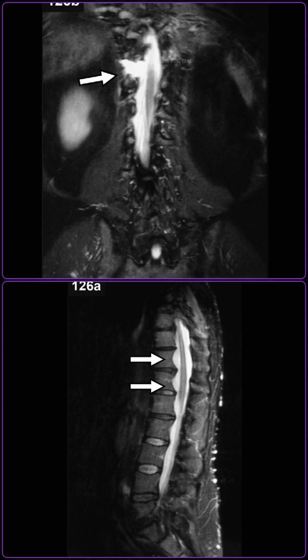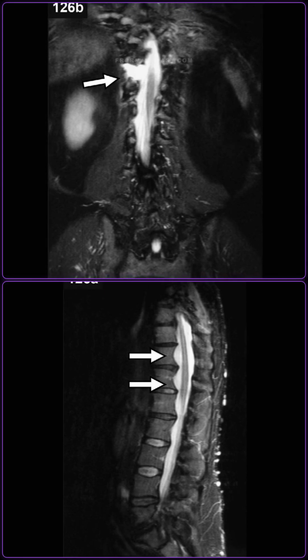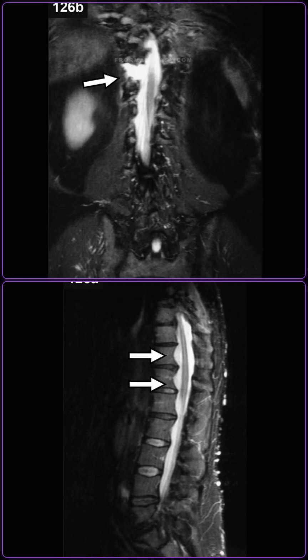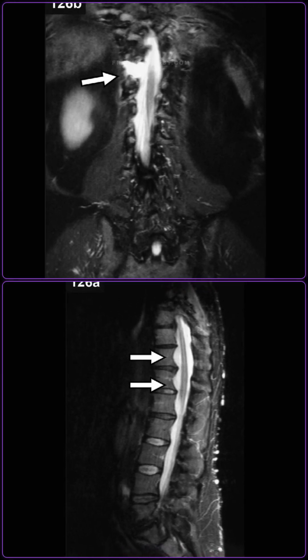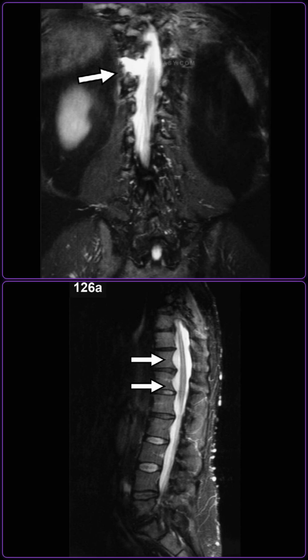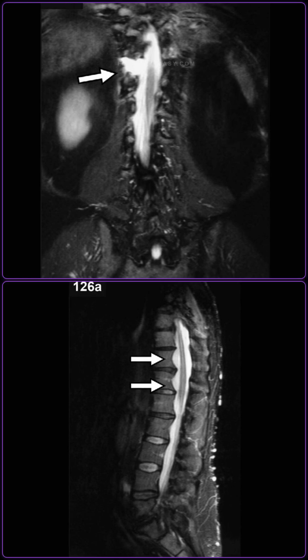On T2-weighted MRI, neurofibromas often display a characteristic target sign, consisting of a hyperintense periphery and a hypointense central fibrous core. Furthermore, a meningocele is directly continuous with the subarachnoid space, which can be demonstrated on thin sagittal or coronal slices. What other abdominal or systemic vascular findings should you search for when neurofibromatosis type 1 is suspected?